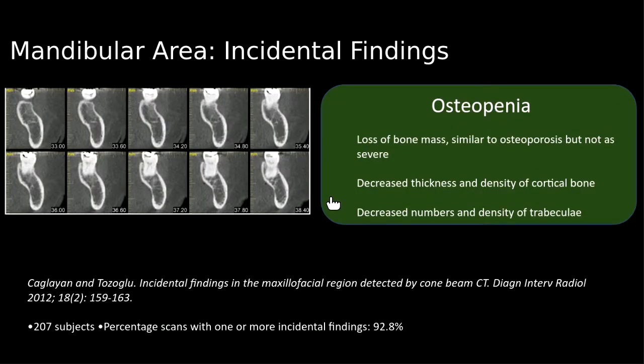Again, for the elderly lady, this came, and you can see there's a loss of trabecular bone mass, and a lot of osteoporotic, osteopenic changes, and a reduced thickness of bone density and cortical area. So these are the osteopenic changes going on. And once you have the blood testing and the report done, then you can call it osteopenia. Other than that, if you don't have a blood report, you have to call them osteopenic changes. That'll be pretty good. Okay.